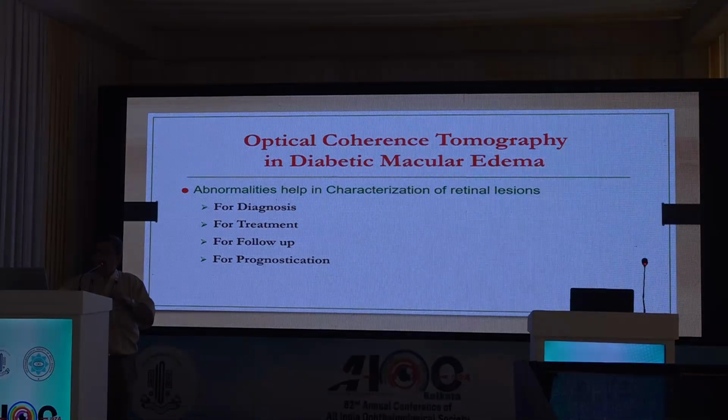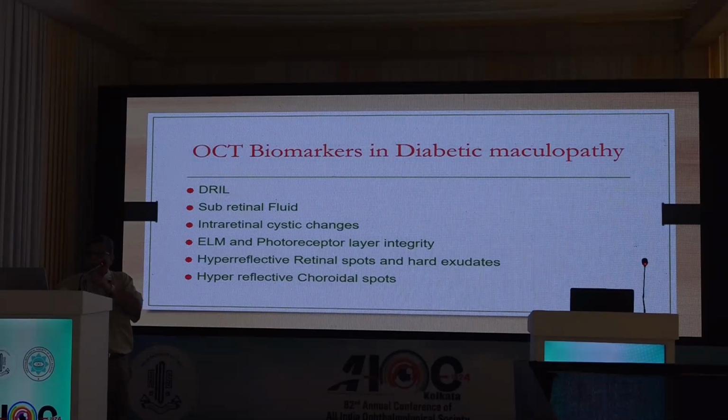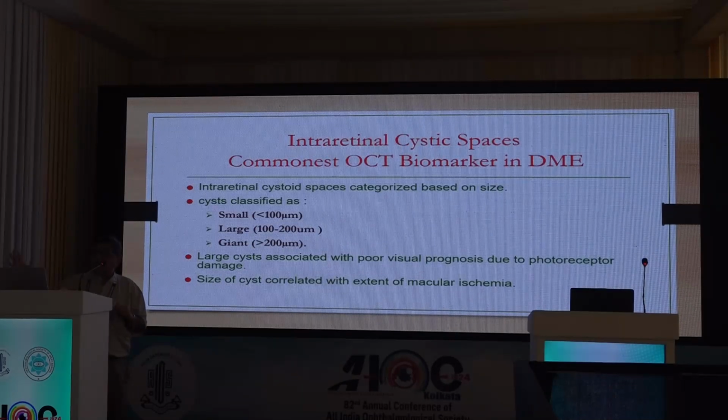Ladies and gentlemen, in diabetes, there's a lot of patients whom you need to see, both for diagnosis, treatment, follow-up, and prognostication. You need that. The various lesions called DRIL, subretinal fluid, intraretinal cysts, all these we'll just go through. Now, the commonest thing is intraretinal cystic spaces.